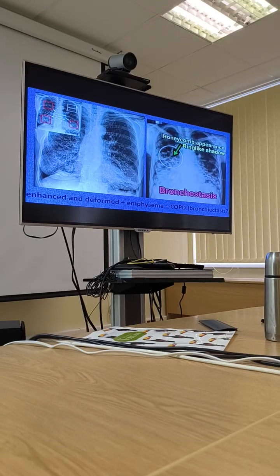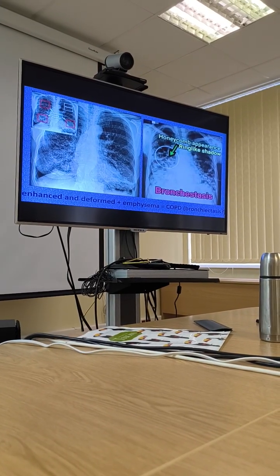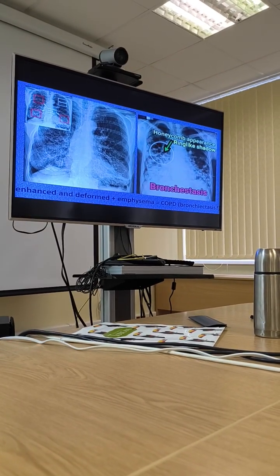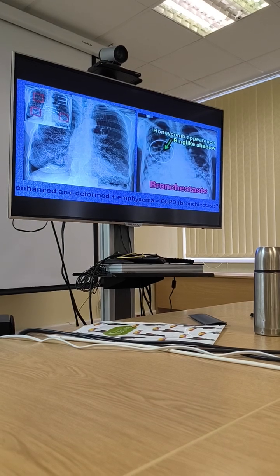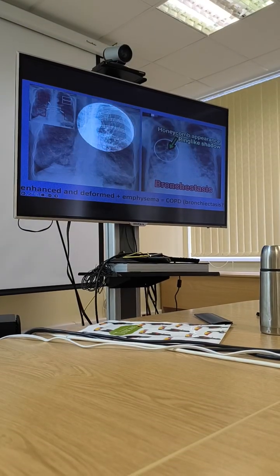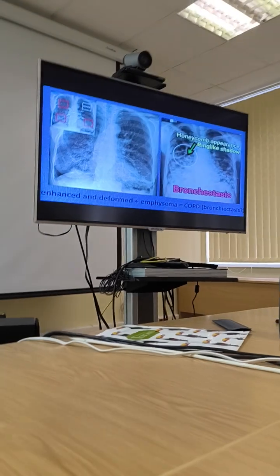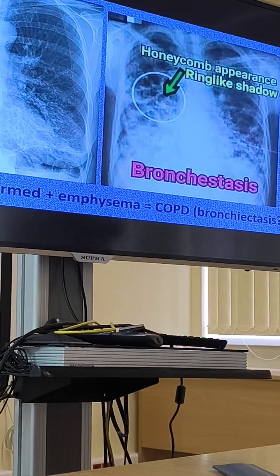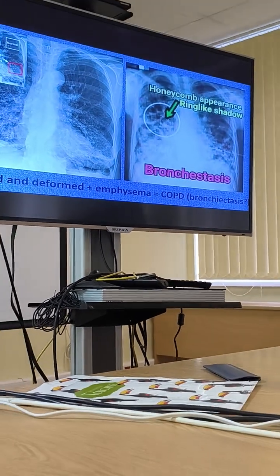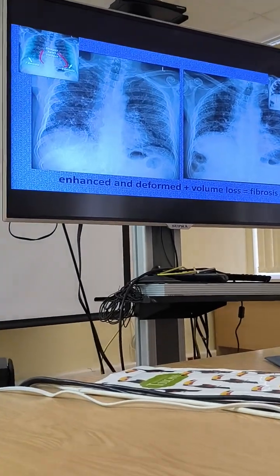We can have pneumofibrosis in a situation of chronic obstructive pulmonary disease, and in this situation, it's usually in combination with emphysema. Feel the shape of the lungs. And actually, this is an elderly person. Pay attention to this aorta. And if we have a closer view or we have a CT, inside this pneumofibrosis we can find real bronchiectasis. So this is one situation, and this is the situation which is completely different.